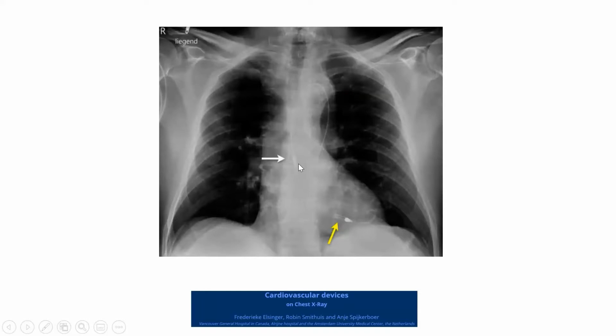An Impella has an inlet tube and an outlet. So again, it works the same function as the LVAD, but from the inside. It is put in the LV. It sucks blood through this inlet cannula, and there is a pump that pushes the blood here above the aortic valve. So again, it is bypassing, relaxing or resting the LV, or guaranteeing adequate cardiac output during high-risk PCIs, because this is one of the indications for Impella.